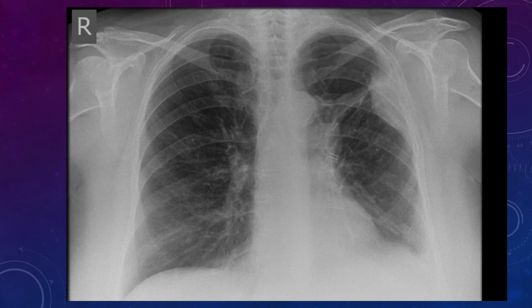So this is pleural based. Look how it comes up, the pleura quite smooth, and then you get this lovely smooth curve running up. We've got some surgical clips here. We've actually got clips there, and then again going off. So pleural based lesion. Again, think about the ribs. Can we see all of the ribs? Can we follow them all the way across? Have we got rib destruction? These are the things that we need you to be taking into account, okay?